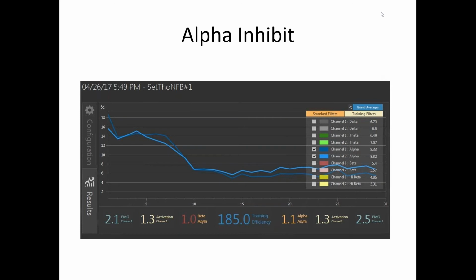Yep. I really like that, to create a sort of an archive for your client where you take a quick screenshot from every session. And that gives you an idea over the long term. Keep in mind, what's the purpose of a trend screen at all? We try to detect success, or at least the response of the client to biofeedback.